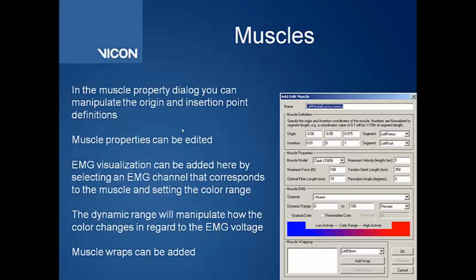And then where it's got that color range there in the middle, you can actually adjust that so as it becomes more highly activated, it can change color so you can watch that throughout the trial.